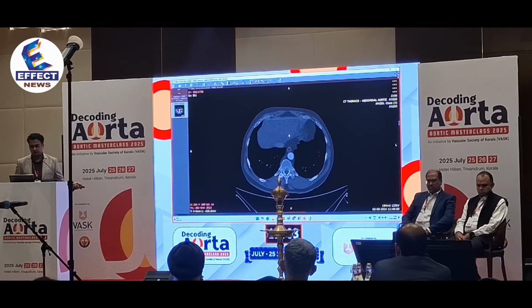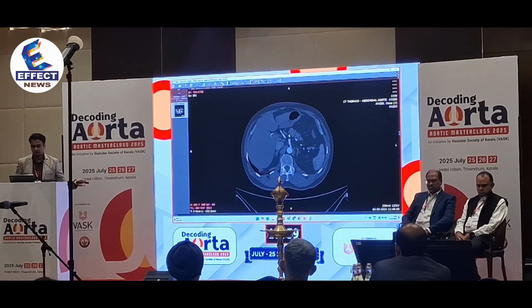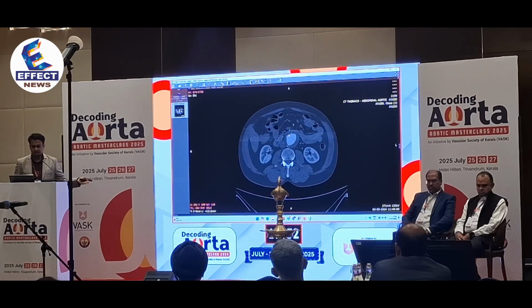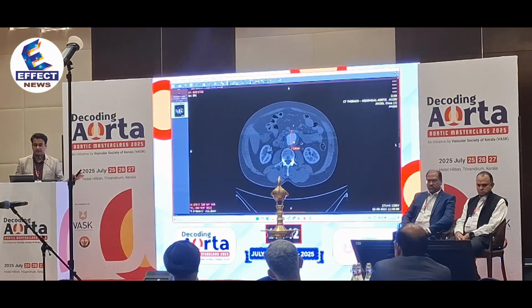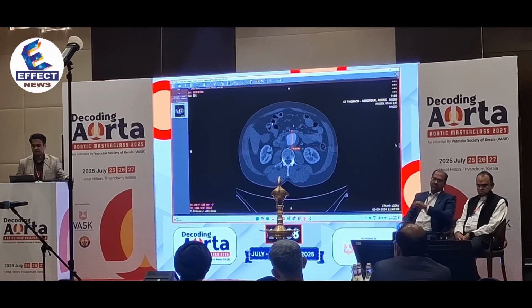Then as you come to the abdomen, first things first, you're going to eyeball the aneurysm itself, of course. So you see that there's a nice infrarenal neck and the aneurysm starts. Like I said before, you can take the measuring tool that's up there, and you can do an AP diameter measurement. So this came as 5.3, 5.4, but since he is a young person and a relatively small-built person, we considered him for open surgery.